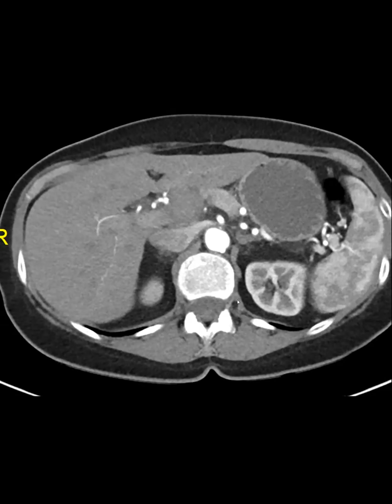And when they went back and looked at it, indeed, it said something about blood products, but that wasn't very convincing, right? Because they could have gotten some blood products just from the biopsy. Anyway, they decided to go along, and they sent the patient to IR for an angio, and indeed this was a pseudoaneurysm arising from the GDA, and they embolized it.